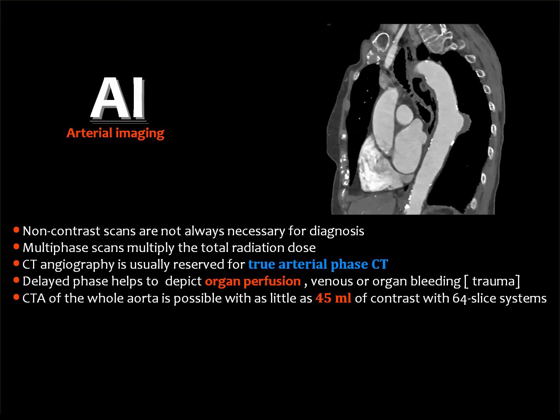Then in order to enhance the value of CT in assessment of vascular imaging, we actually do not need usually to scan the patient before injection of contrast material. Sometimes this is necessary, like in the coronary imaging, to assess for the calcium scoring. But the images that are of value are those obtained in the arterial phase.